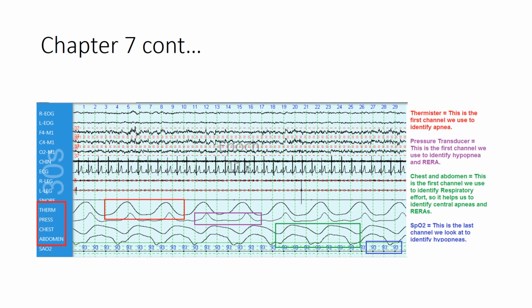Here are some examples of some respiratory signals. I want to make sure we all look at this together too. We have the thermistor. I have a couple breaths outlined in red. At second 3, right where my red box starts, that is right where inspiration begins, or just before inspiration. There's a pause, and then as you see the line move upward, that is the patient taking a breath in. Then it reaches its peak, that is the end of inspiration. As you see the line go back down the other direction, that is their exhalation.